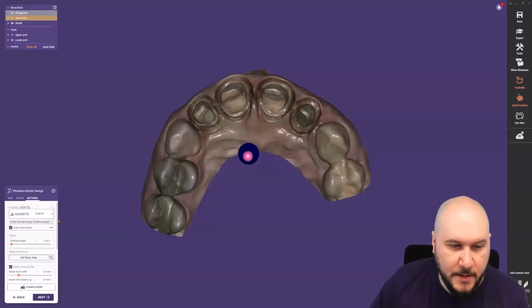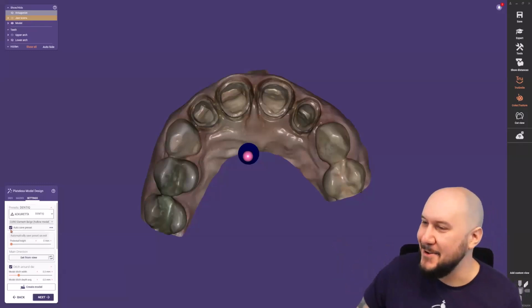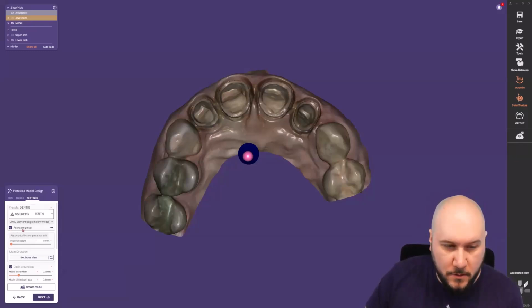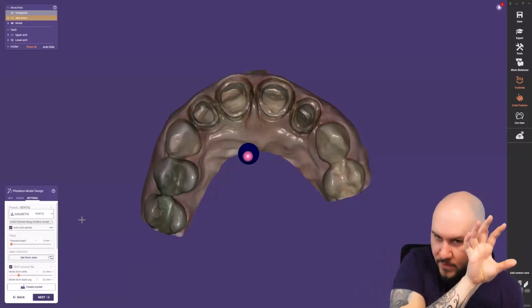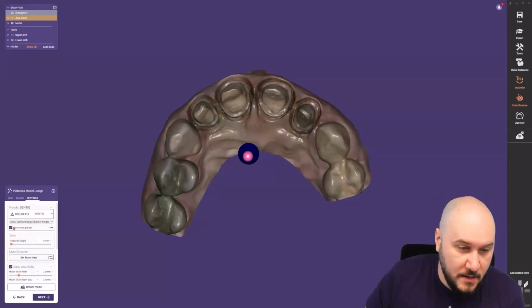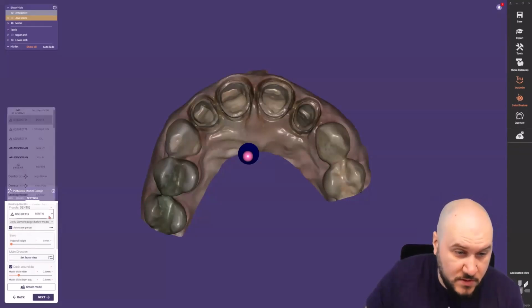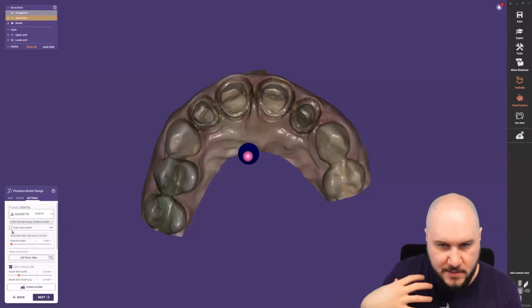Also with the settings here, what you can see directly, because this was something that I think one of my former presenters did, they saved the automatic presets for that. And you can see right away here, every time I start the model creator again, not even with the model type planning, also with the saved presets here, this is directly chosen. But you can also save them here. If you don't want to use it for the next time, uncheck that checkbox, and then it will just have an empty field.